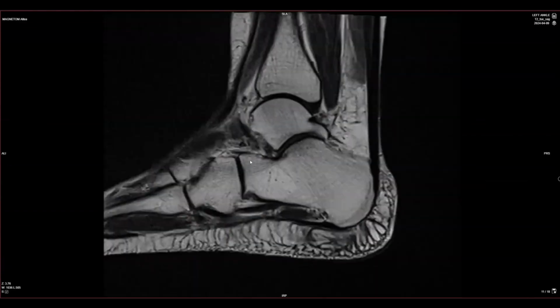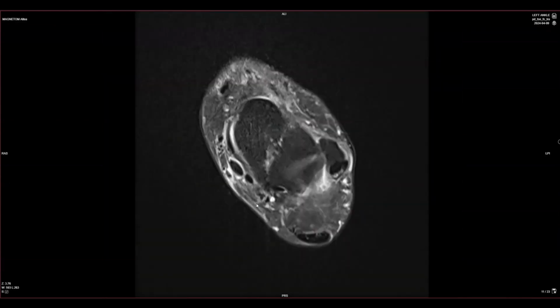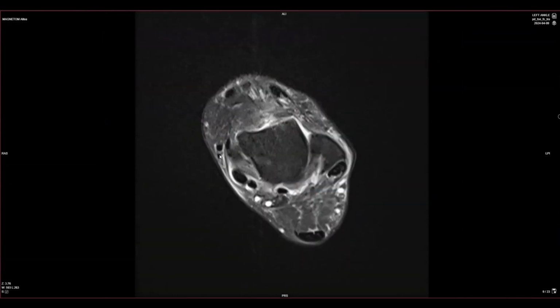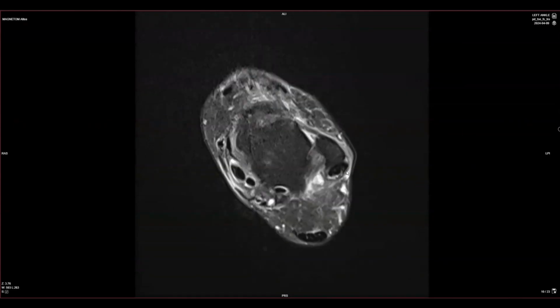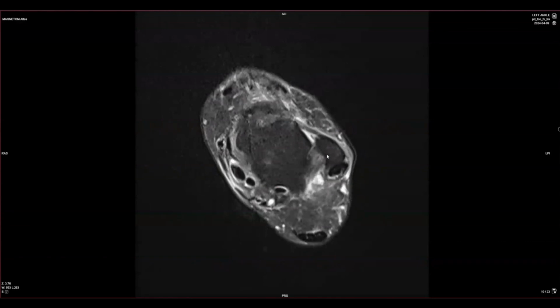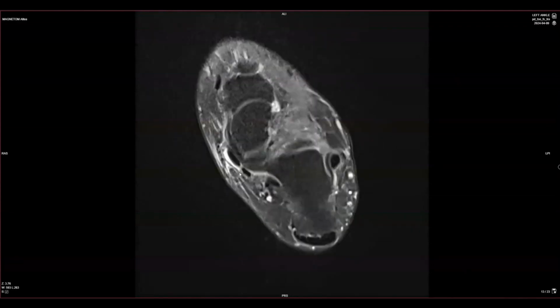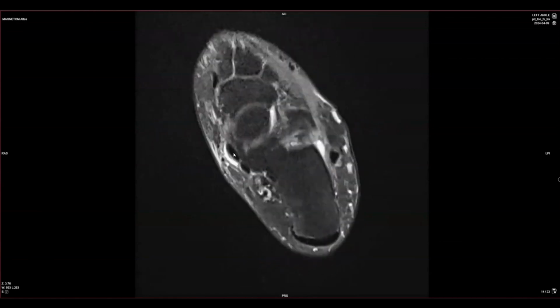One thing we didn't talk about is the sinus tarsi, this partial preservation of the fat. So getting back to after the medial flexors, hypertrophic PT, peroneus brevis split, SPR tear, lateral collateral ligament complex, subacute on chronic, grade 1 to 2 sprains. I would say grade 1, that they're thickened with periligamentous edema, and deltoid, same story there. Grade 1, subacute on chronic with some thickening and periligamentous edema.